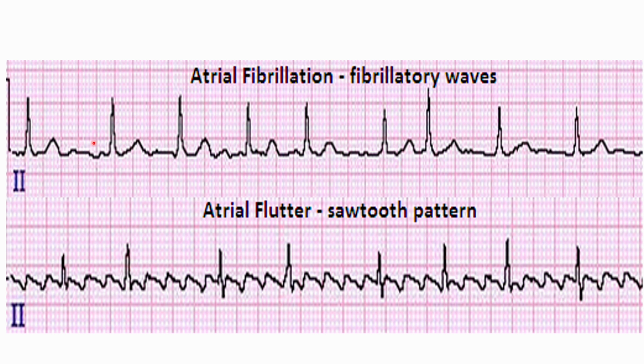And check out the QRS complexes. One happens here, here. That looks about the same length. This one's quicker. This one's a bit longer, then shorter, then a little longer, about the same. The QRS beats, they're not happening at regular intervals.